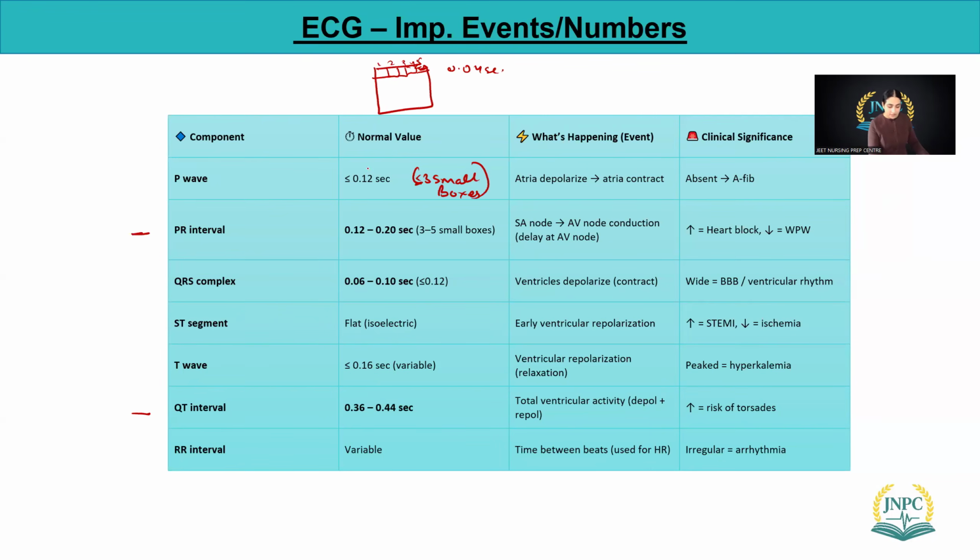So what is happening when the P wave is forming? We all know. But if you cannot locate where that P wave is, if instead of a P wave it's just waves, then just know that this is atrial fibrillation. That is very important. If you cannot locate that P wave, it's waving. So that's the fibrillation. And AFib is always irregular.